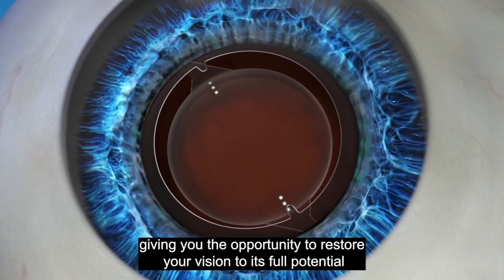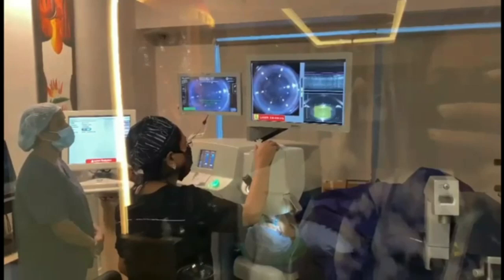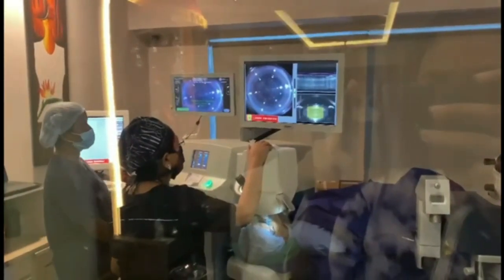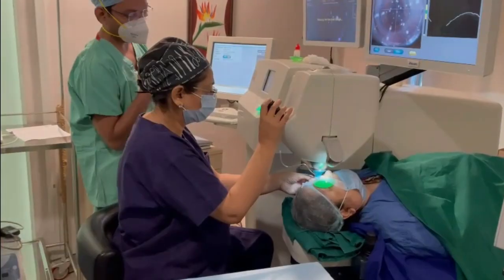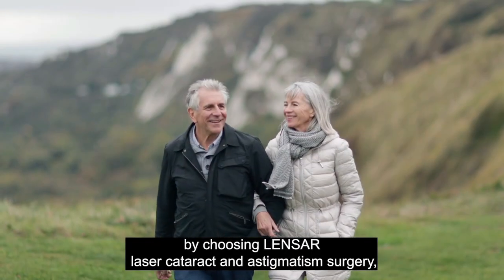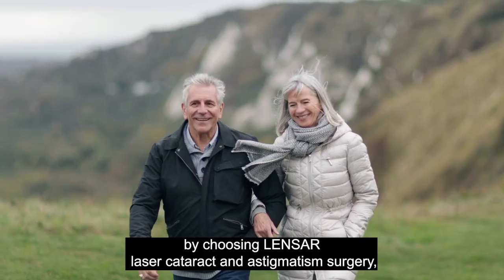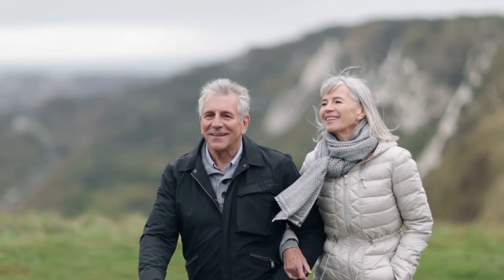So in short, a femto laser increases the safety of the procedure. Safety is the biggest benefit. Second, the precision is much more, the reproducibility of the procedure is much more, and most importantly for the patient, there is faster healing, lesser swelling, crisper vision, more safety.